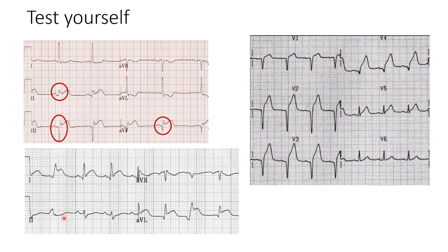Then let's look at this one. Over here we see a slight Q wave in lead 2, not much. AVR we ignore, and then in AVL we see something as well. So that tells us that this is affecting the lateral region, and it is also accompanied by some ST elevations, but they're not very severe, so you could say it's acute to subacute.